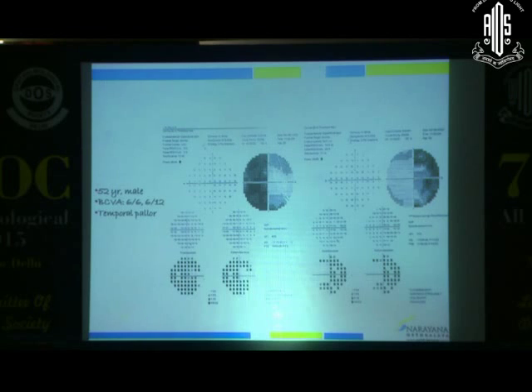Similarly, the other eye, in view of the poor control, doesn't have a significant defect, but this is a diabetic papillitis.